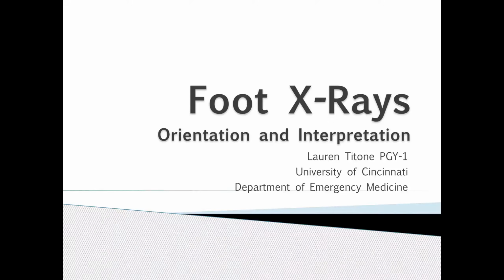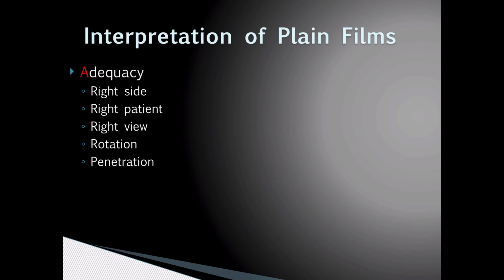Hi again. This is the second part of the two-part video series reviewing x-rays of the foot. In this video, we will discuss how to orient yourself to and interpret foot x-rays. First off, here are some basic rules that you can use for interpretation of any x-rays.